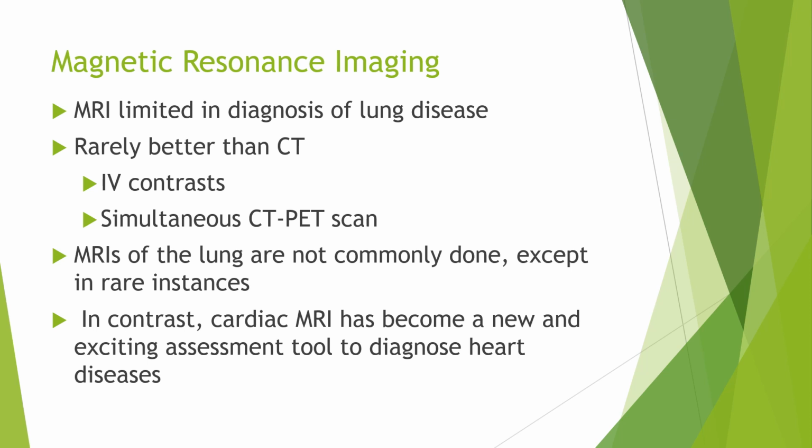So hopefully that's just a little big picture of CT scans, and CTs in different disease processes, and yes or no for different disease processes. So it gives you a little bit more orientation and information. So when you're looking at CT scans, you're not starting from nothing. At least you have some basic look to them.